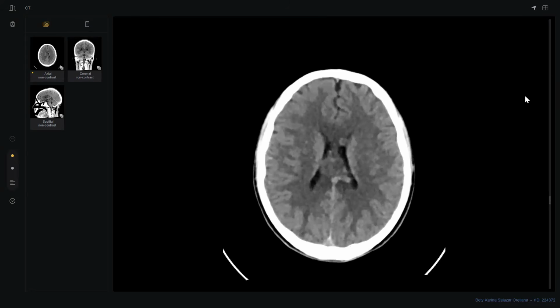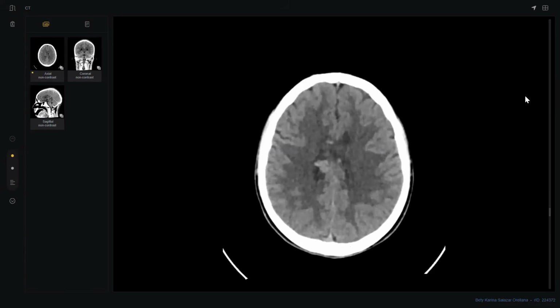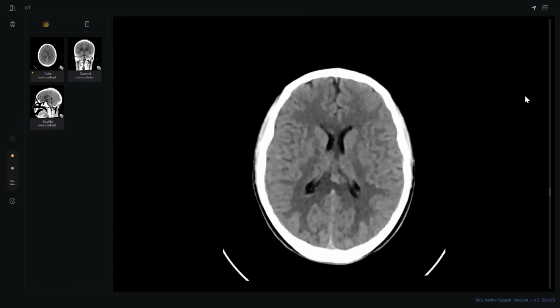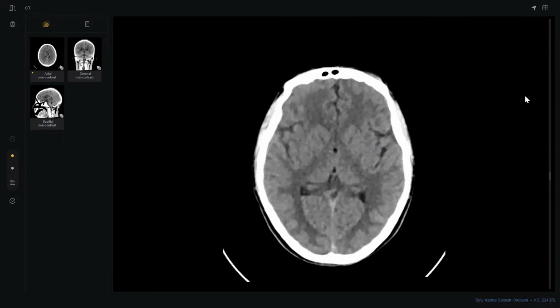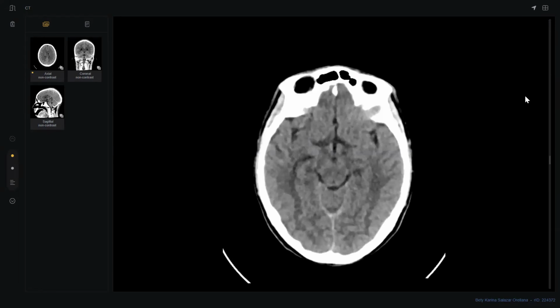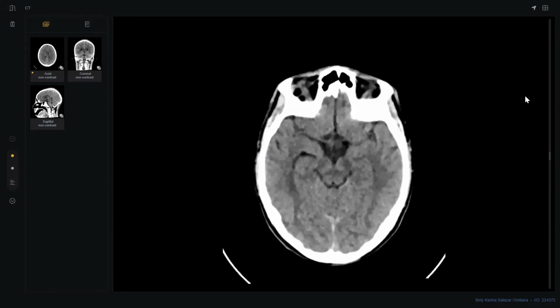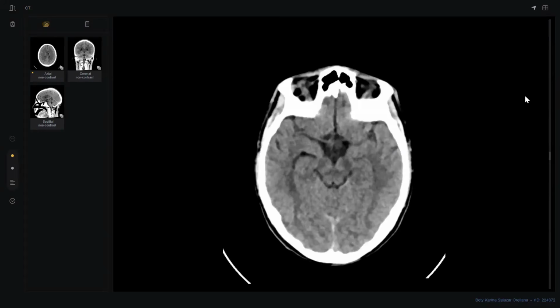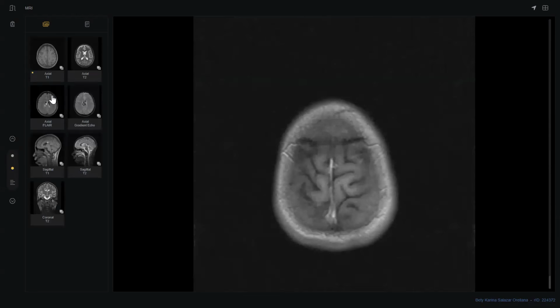There appear to be hyperdensities within the gray-white matter junction as well, and within the splenium of the corpus callosum. I would check the midbrain. There appears to be faint hyperdensity within the midbrain. It appears heterogeneous compared to normal, so I'm suspecting grade 3 diffuse axonal injury. However, I would like to further do an MRI with susceptibility weighted images because it's more accurate.